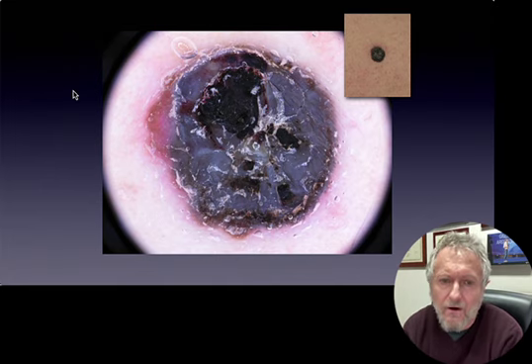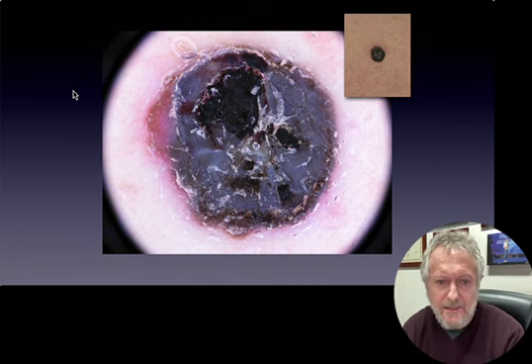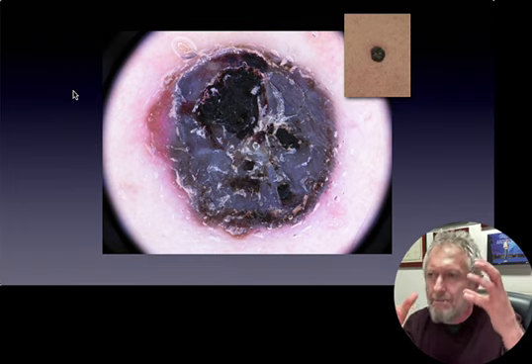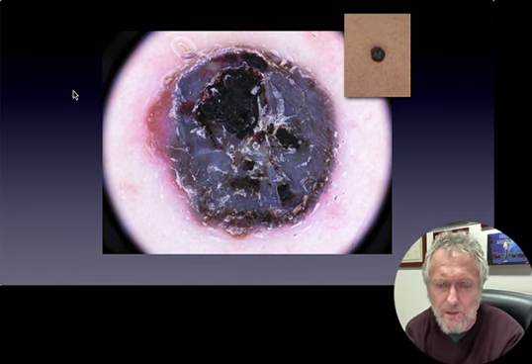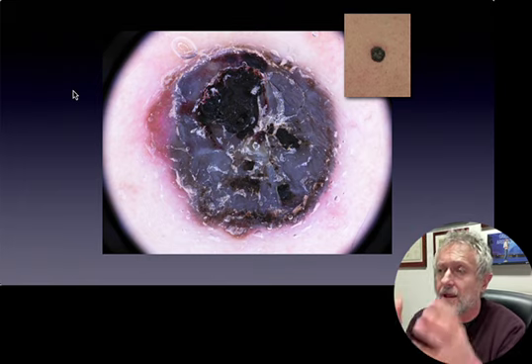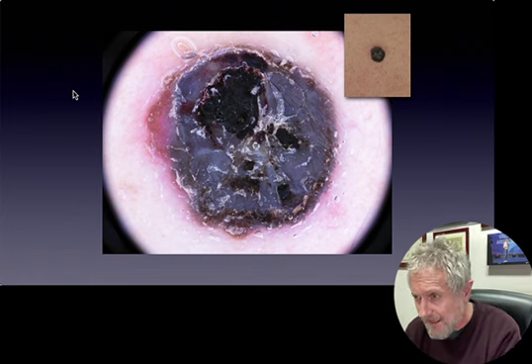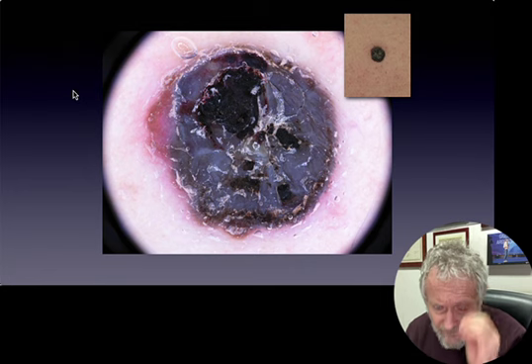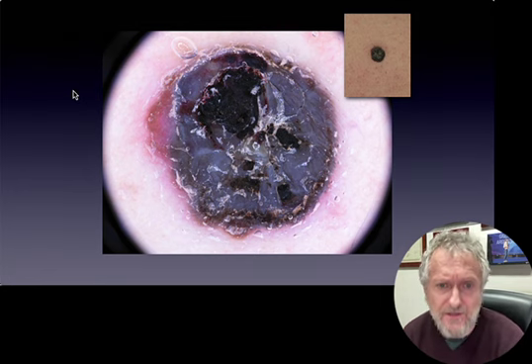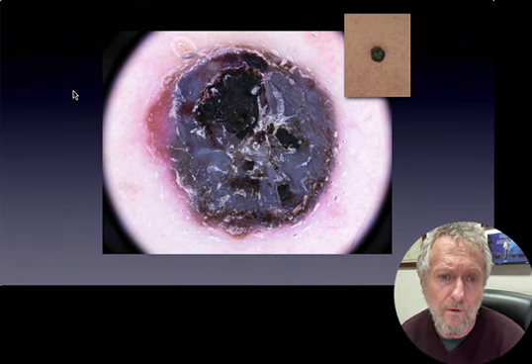could be lacking the typical melanoma-specific criteria like atypical network, streaks, black dots, globules, regression, and so on. So you only see a predominantly bluish nodule, but very often nodular melanoma also shows a black component in terms of color. So the combination of blue and black is something to take very seriously into consideration, and this is an example of a nodular melanoma predominantly showing blue and black color.